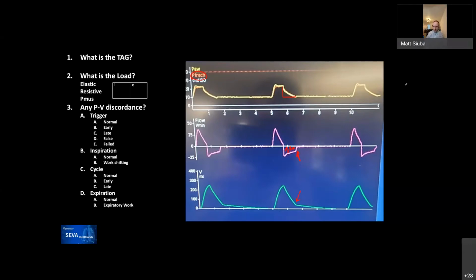So a lot of interesting technological issues we're uncovering with our examination of the expiration waveforms here. It's 2:51. We might be able to do one more quickly. On some ventilators, the ATC function is active during exhalation as well, right? That's correct. On some you can set one or the other. Okay. Yep.